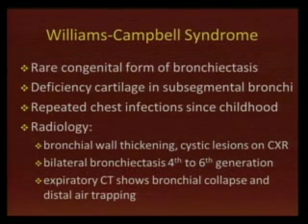Here, in this case, we have multiple bronchiectasis in the lung bases, left greater than right, and you can see that there is a dextrocardia. So because of this situs inversus, you can think that there is a Kartagener syndrome.